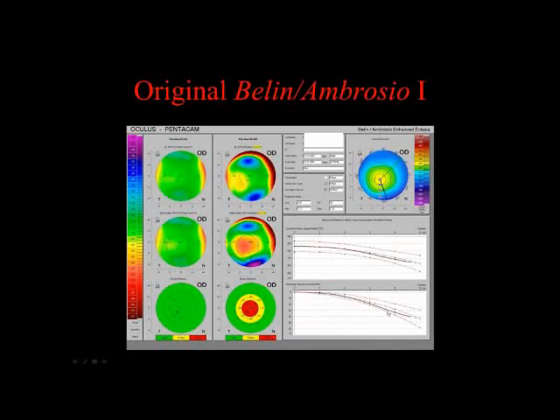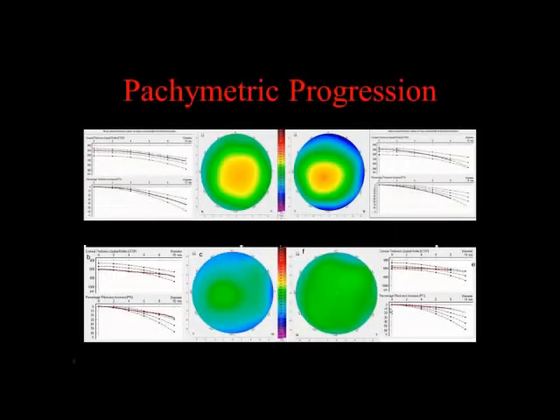And this represents a 95% confidence interval of normal patients and an increase in change. So this is a positive number down below. If the cornea changes more rapidly, the red line will come down here. If the cornea was the same thickness from the center to the limbus, this line would be flat. So this is not as intuitive, but it is much easier for screening, and this is what I'm going to be discussing later.